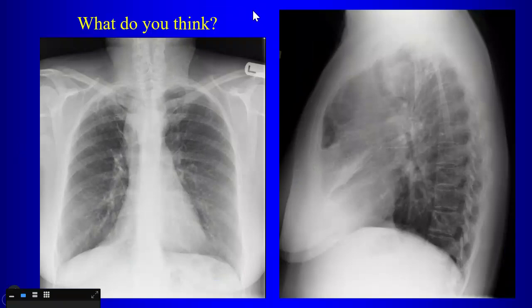Right? Okay, the chest radiograph in this case, what's kind of unusual looking about this chest radiograph? Yeah, this time we have a right aortic arch, right? So there's this right paratracheal opacity. When we look on the lateral view, what do we notice? Yeah, so again, the trachea is bowed forward. What does that tell you? Well, what did we say? What did we say it means?